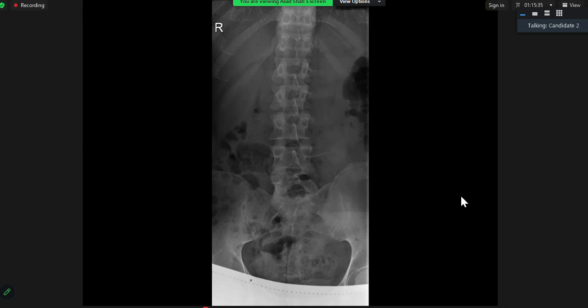I'm looking at the lumbar vertebrae. The interpedicular distance is maintained. I cannot see clearly the left pedicle of the L5 vertebrae. However, I will confirm it on the orthogonal view. Besides this, there are areas of sclerosis involving bilateral sacroiliac joints, more on left side. That is projectional. He is a man. It's okay. They ignore the sacroiliac joints. Okay, carry on.